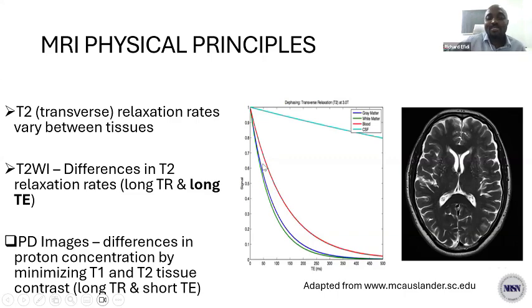If you look at this curve, using the TE parameter, which is used for controlling T2 contrast, we usually want to use a long TE because that's where we get the largest difference between the structures of the brain. So using a long TE, we can see that the CSF is still showing high signal intensity. That's why CSF is white on T2 weighted image.